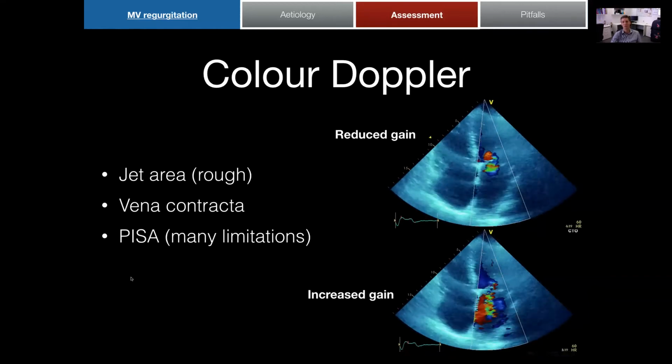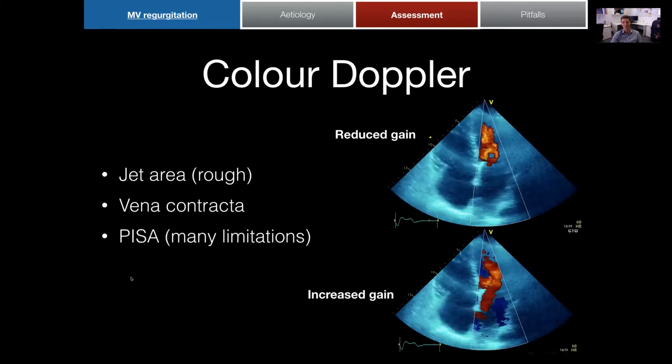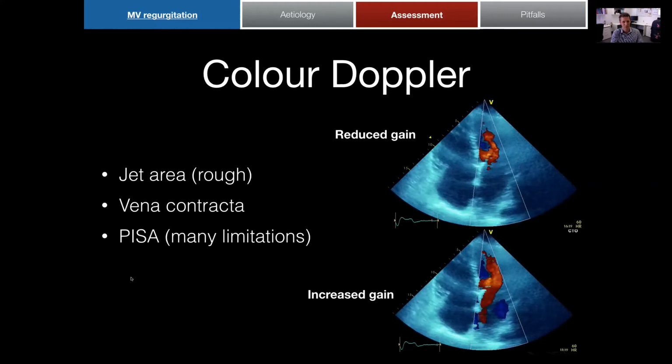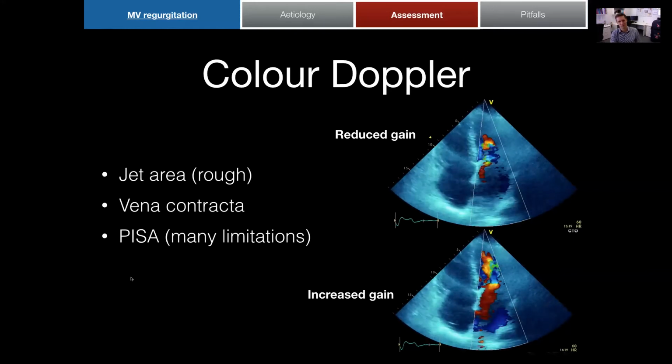It's not something I do routinely in the critically ill or in standard patients, to be honest, because it's so easy to make mistakes. I think we've got other ways of trying to assess it significantly. But it's probably not a universal view, right? We don't do a lot of PISA because it's fraught with hemodynamic instability and problems.